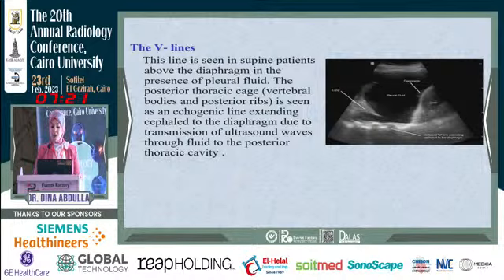There is a hemothorax, a subpleural consolidation with a crowded air bronchogram. In image D, we can see also the stratosphere sign, which represents absence of pleural sliding in M mode. And in image E, we can see that there is a pleural fluid in the costophrenic recess. And in image F, we can see that there is a rib fracture and a chest wall hematoma, a small hematoma at the fracture edges.